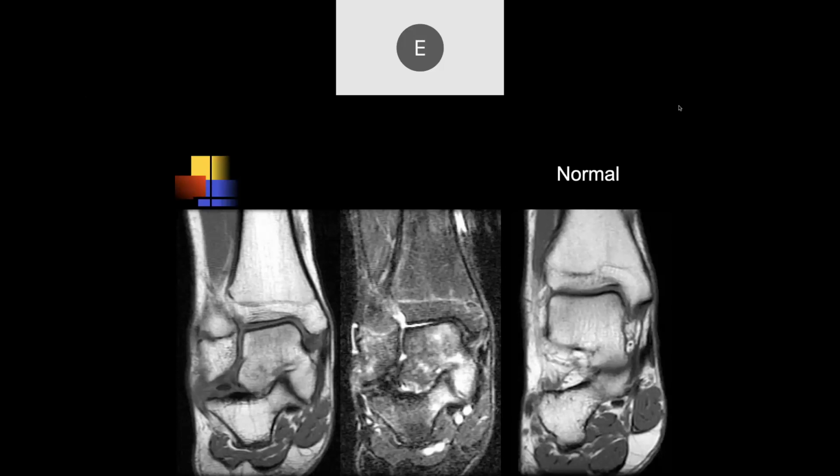Right. So I think there's a coalition between the talus and the calcaneus. We can see the bone edema here. Actually, this joint space looks like it's kind of maintained. It's nice and smooth here. What this is, is abnormal orientation of the medial facet. The normal medial facet should be horizontal with the floor. This is at an angle, as we see there.